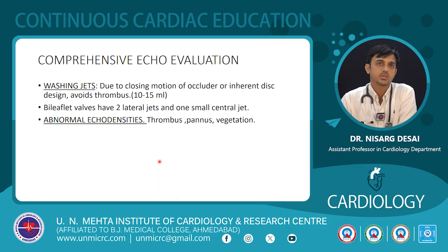Second is washing jet. So not all regurgitations are pathological. Most of the time this bileaflet valve has an inherent design in order to avoid thrombus. So about 10 to 15 ml of regurgitation is inherent to the valve design. It is not related to a pathological abnormality.